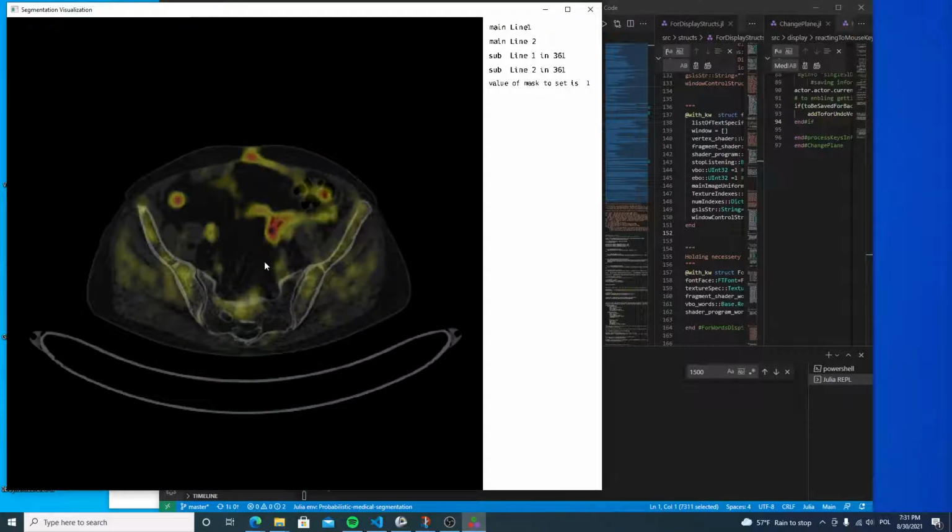So how can I modify? I cannot modify PET manually because I said that this is impossible in a texture specification. But I can do different things with it. I can, for example, change the visibility, so how much the PET is visible relative to the other masks. I do it by pressing F6 and then minus or plus.